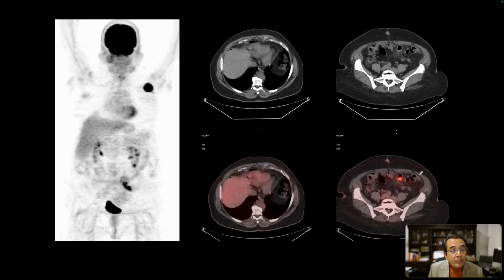But also on this next set of images in the same patient, as we were reviewing the abdomen and pelvis, we found free air. And this free air is also seen right here. And this was a complication of their diverticulitis, where we see some uptake of FDG as a result of inflammation, also seen here. And there is some fat stranding that suggests inflammation and a focus of free air in this region also.